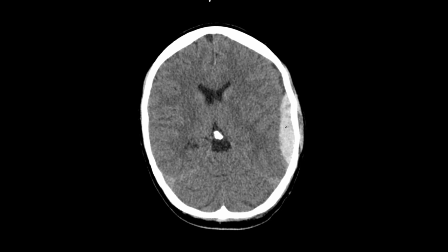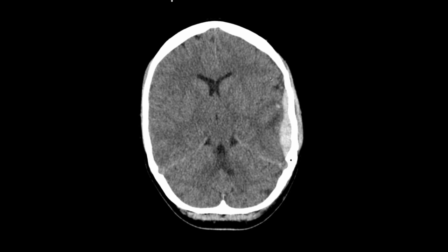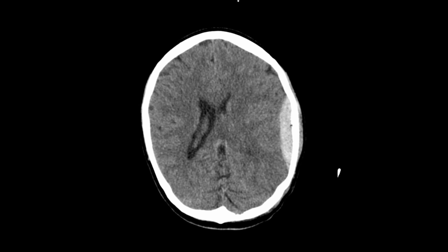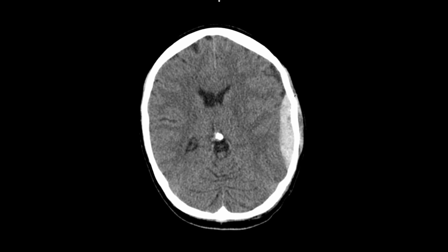Subdural bleeds spread where the internal surface is concave and the external surface is convex, because they are not tethered by the attachments of the meninges, the dura, to the skull vault. It is quite nice from a radiological perspective and a diagnostic perspective that the internal blood corresponds to the external soft tissue swelling, which will also be some blood.